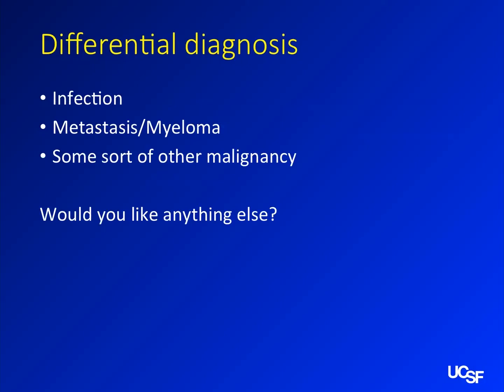Oh yeah. So there is a differential for this. You can have lymphoma, mets, myeloma, and there is something that will help you differentiate. What would you like?